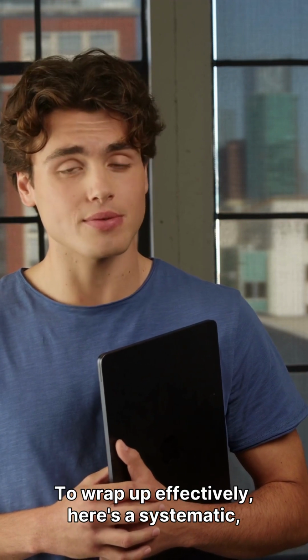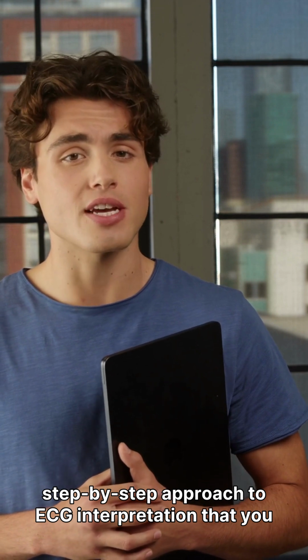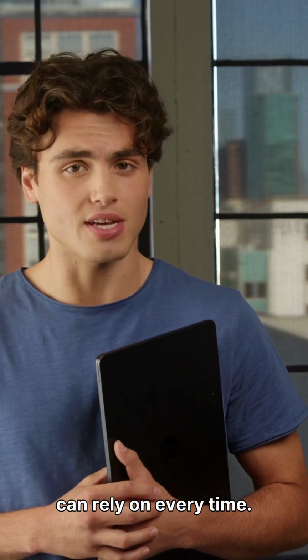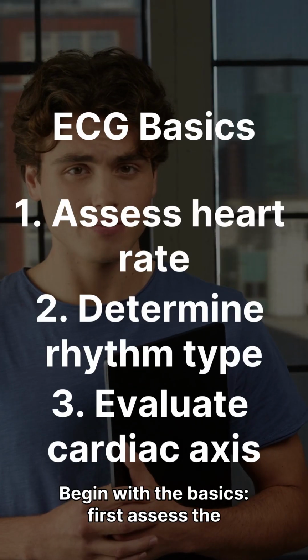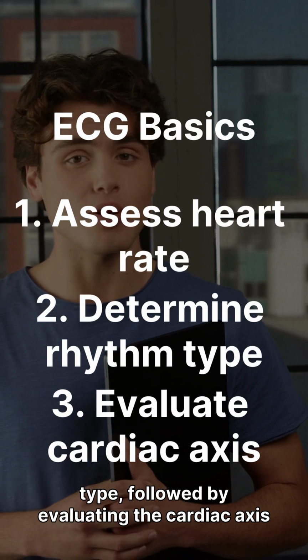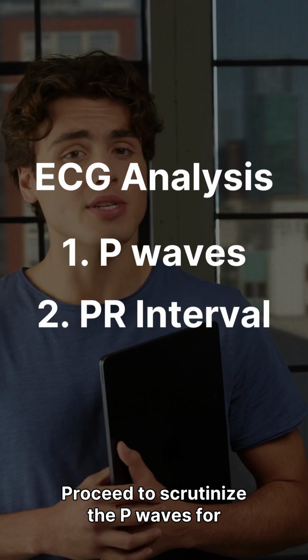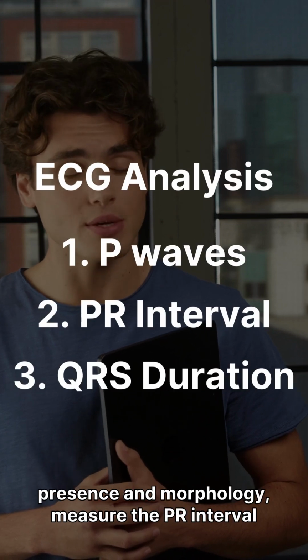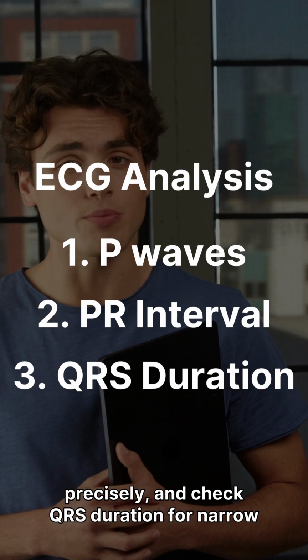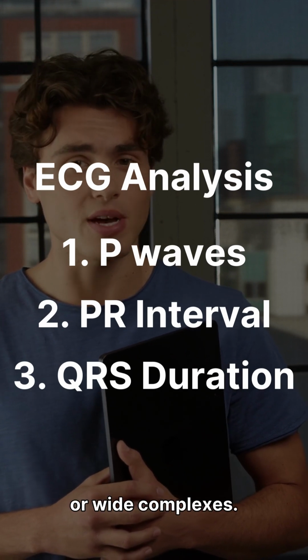To wrap up effectively, here's a systematic, step-by-step approach to ECG interpretation that you can rely on every time. Begin with the basics. First, assess the heart rate accurately, then determine the rhythm type, followed by evaluating the cardiac axis orientation. Proceed to scrutinize the P waves for presence and morphology, measure the PR interval precisely, and check QRS duration for narrow or wide complexes.